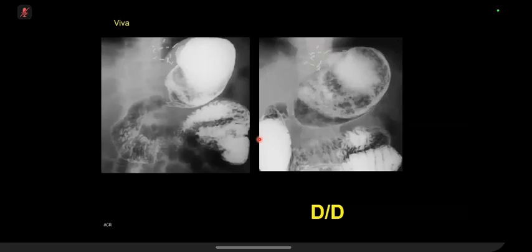Okay. There are surgical clips projected over the gastroesophageal junction. There is pooling of contrast in the first film on the left, which I think is an AP projection supine, predominantly in the gastric fundus. The configuration of the stomach looks slightly unusual.